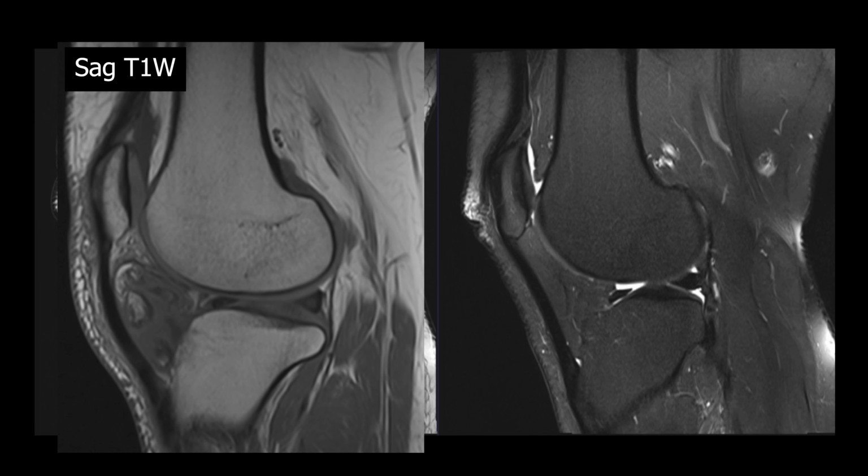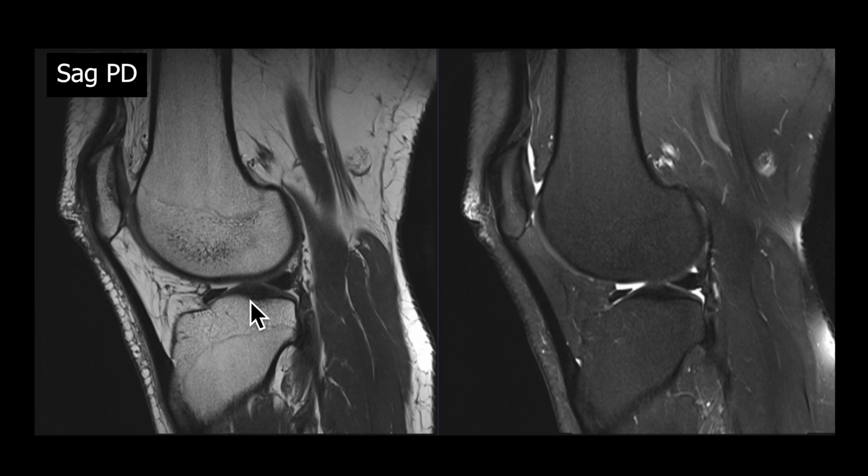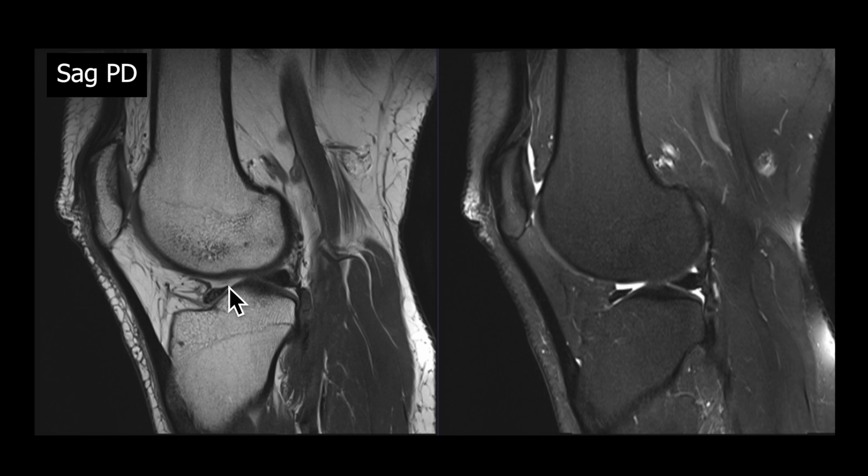The difference is that on T1, the cortex, cartilage, and joint fluid will be of low or dark signal, which is different to what you see with the PD weighted sequence here, where this area of joint fluid, which we can see here on the T2 weighted sequence, is bright. So in PD, fluid will be bright, on T1, fluid will be dark. There are some other special sequences that we use less frequently, which will be discussed later as we go through the case-based course.